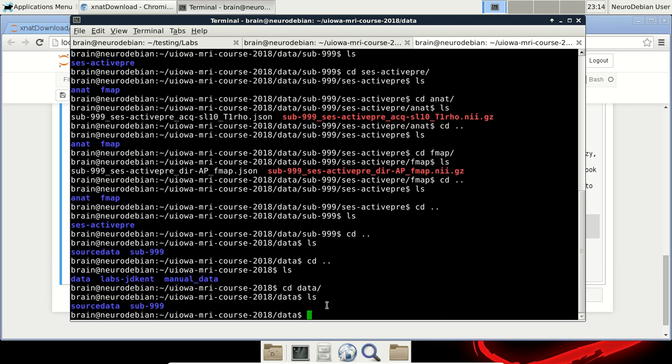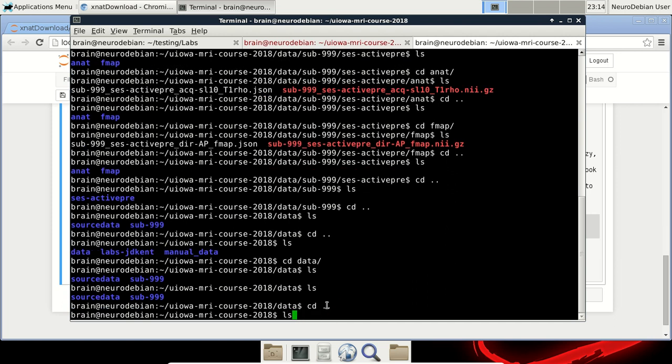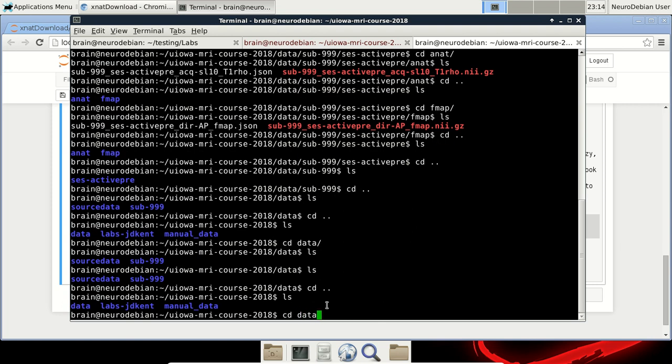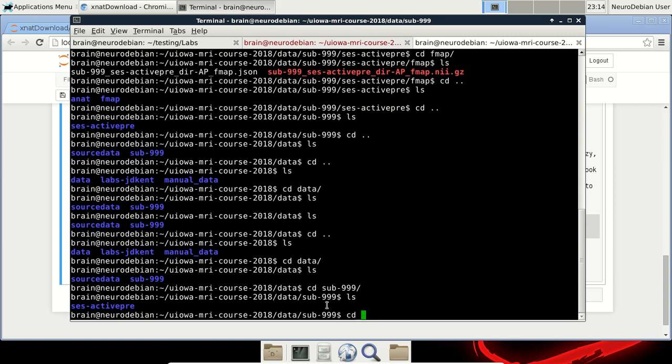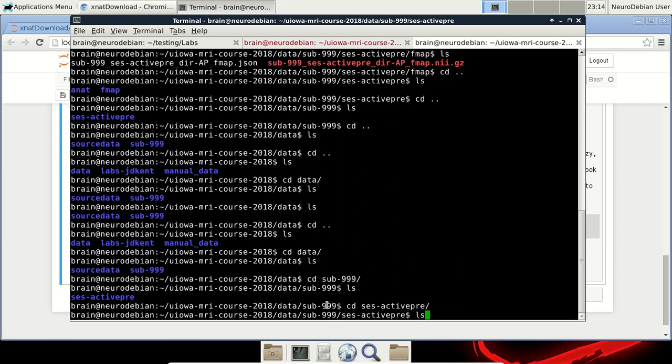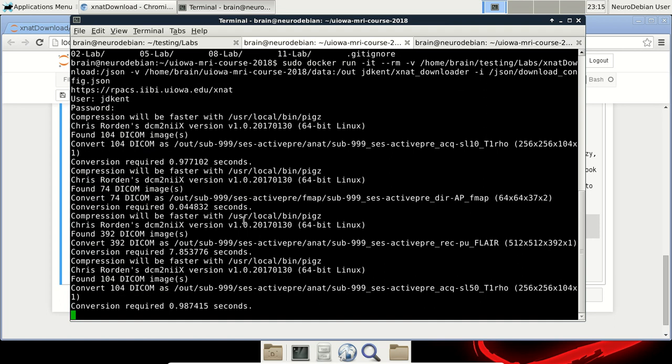If we did a task, then we'll need to additionally conform and extract data from our behavioral data files, etc., and so on and so forth. And I think that is all that I wanted to cover for this one.